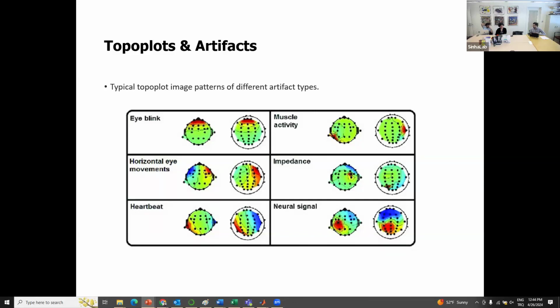It's just another component that I wanted to show here. That's what we would like to focus on. The IC label I mentioned earlier names it differently. It says brain, which means the original brain signal. So based on the framework you use, the naming convention might be different from what I used here, just so you know.